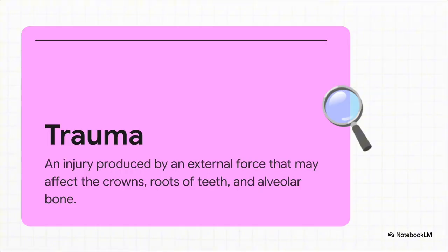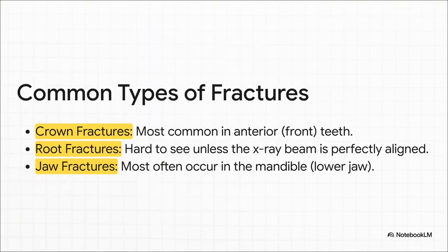And yeah, you might see a chip on the surface with your own eyes, but the X-ray is absolutely crucial because it tells the rest of the story. It shows that hidden damage to the roots and the jawbone that you would just never ever see otherwise. It's pretty cool how different kinds of fractures show up.